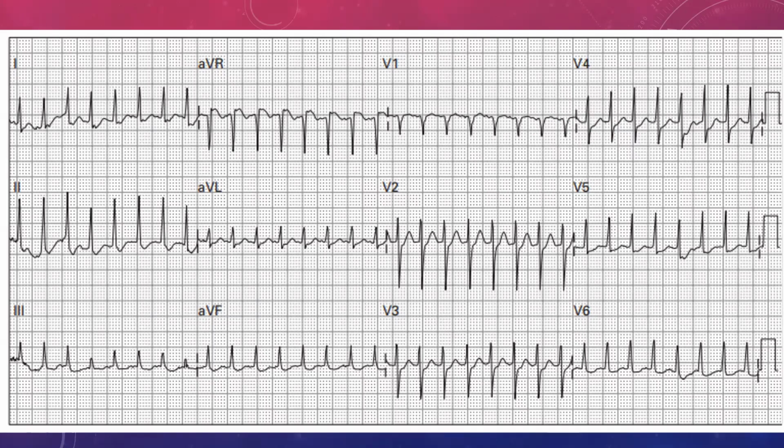So I'll say it again. We have a tachycardia, we have a very regular tachycardia, and we have a narrow complex tachycardia. Sorry, it's absolutely regular. And because it's narrow, we know that the tachycardia is coming from above the ventricle. I don't think I can give you more clues than that without actually giving you the answer. So what do you think we'd call a tachycardia that's starting from above the ventricle? Any idea? I'm sure you would have heard the term before.